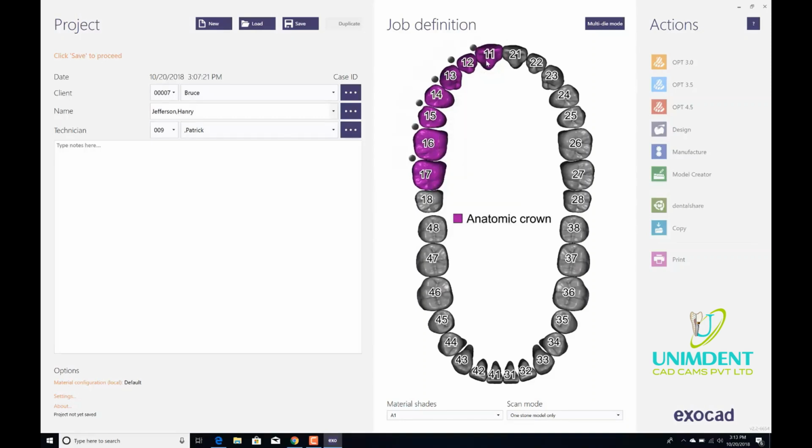All right, so it's pretty easy, and once you understand it, it's going to be really helpful. And let's say I now want to deselect some teeth, right? I want to deselect the number 11, 12, 13, and 14. How can I do this?